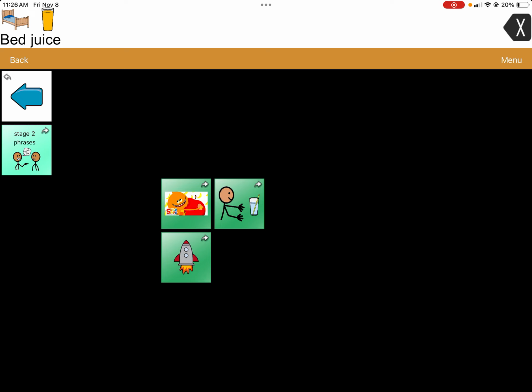So when they're ready for stage 2 and you know what those words mean, you don't want to get rid of their stage 1s. They might eventually come back to these stage 1s when they're in environments they're not comfortable with or new places, or having them in there, you never know when they might want to go back to their stage 1 gestalts. So the stage 2 ones, I also made sure to put them in the same spots of the words when they're on the home page.